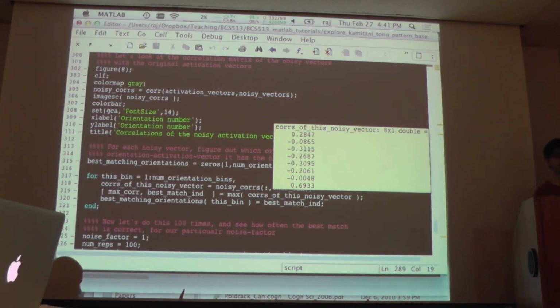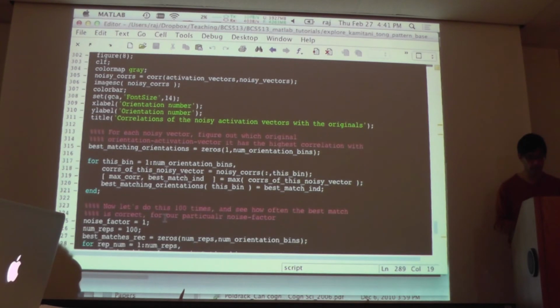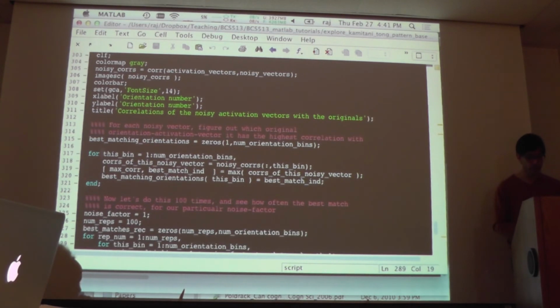And that's fMRI decoding. Now, there are lots and lots of tweaks and variations you can do on this. This is not by any stretch of the imagination the fanciest or most powerful classifier, but it's actually a fairly good and robust classifier in many cases. But that's actually how you do it. So this is literally how you would implement in Matlab a very simple, and fairly effective, classifier.